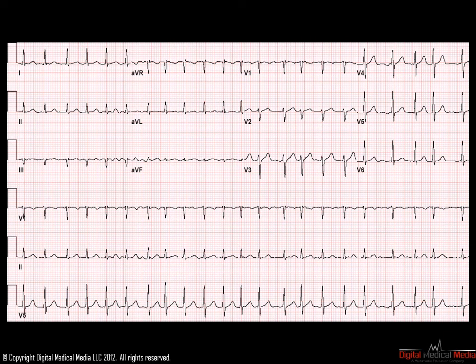We look in front of each QRS for a predictable and organized atrial activity in the form of a P wave. As we look across V1, which is an excellent lead to look for atrial activity, we cannot see any organized and predictable P wave across this tracing. The baseline between each RR interval is unusual. This represents atrial fibrillation with a rapid ventricular response.